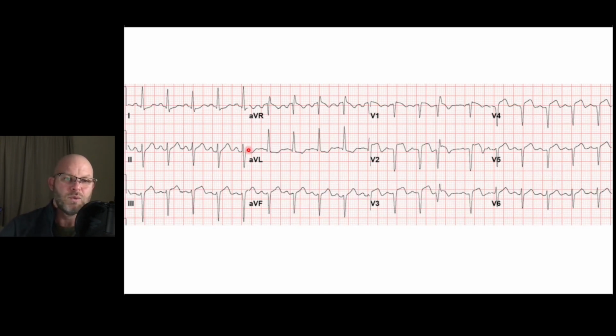This one here, lead 1 is positive. That's good news. We're heading toward the patient's left. That's the left shoulder. aVF is negative, though, so that puts us heading up. So we're in that quadrant near that left shoulder that says some of this is good, a normal axis, some is negative, a left axis deviation. How do we differentiate? We look at lead 2. Lead 2 is negative, meaning we're heading more toward the torso than the waist. So this is a left axis deviation.